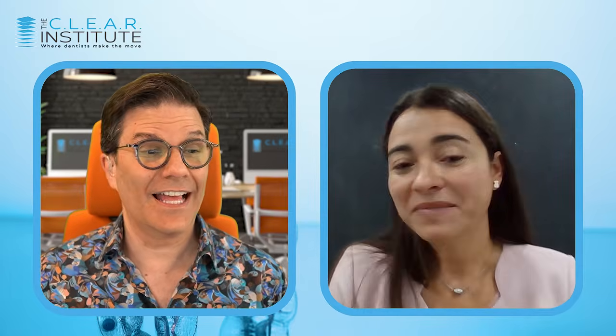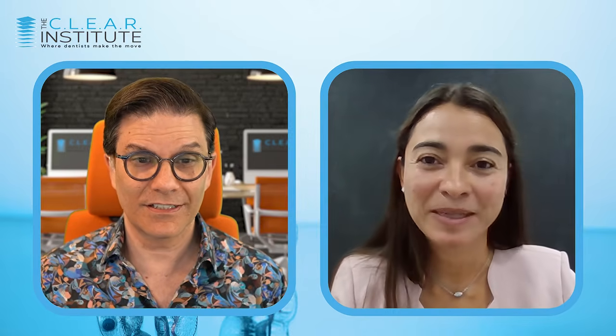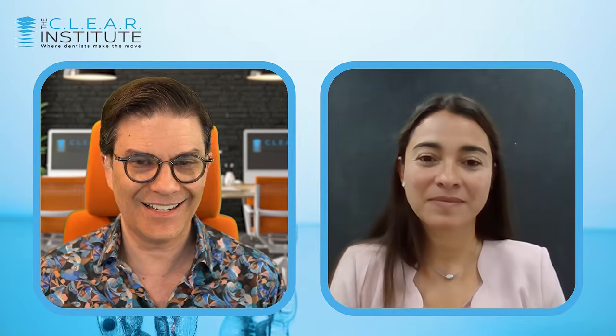And listen, that was amazing. That was an amazing presentation. Really, I really liked what you did with the case. And with the experience I have, I can see, like I told you, how predictable the treatment plan you did will be compared to the initial setup that was done by the computer.